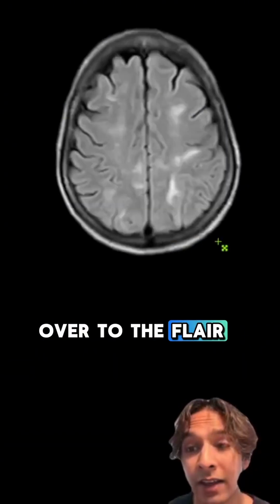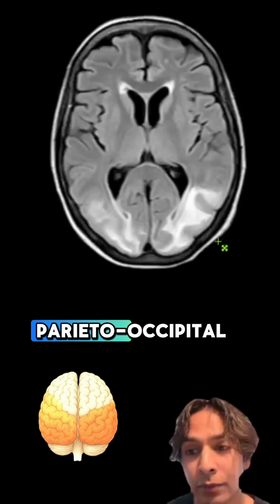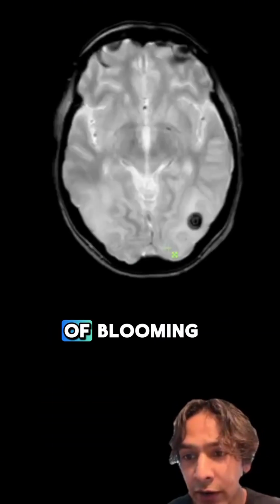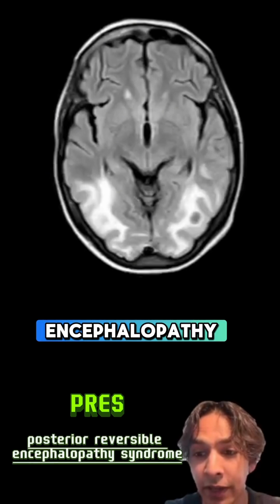So if we switch over to the FLAIR sequences, we can see this much more clearly. So that bilateral symmetric hyperintense FLAIR signal within the parietal occipital lobes. So when we switch over to the heme-sensitive sequences, we can see two well-defined areas of blooming artifact within the left occipital lobe here. So this is an example of PRES, which stands for posterior reversible encephalopathy syndrome.